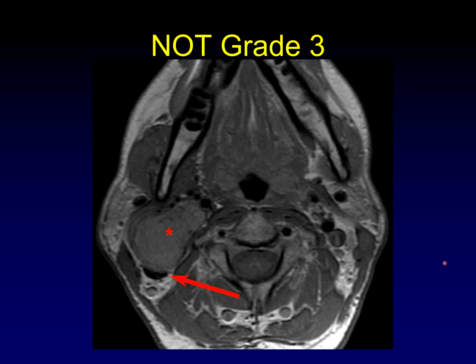It turns out that in this case, this actually is a grade 2. It's not obvious on this one axial image that this isn't a lobulation, but it turns out on multiplanar evaluation, this turns out to be grade 2. You just can't tell on this one image.